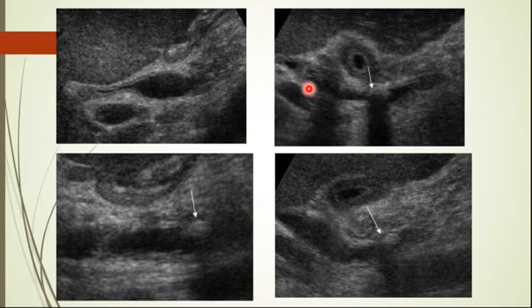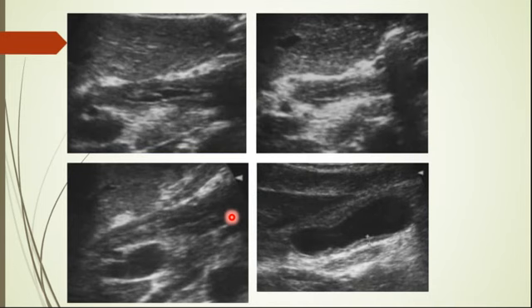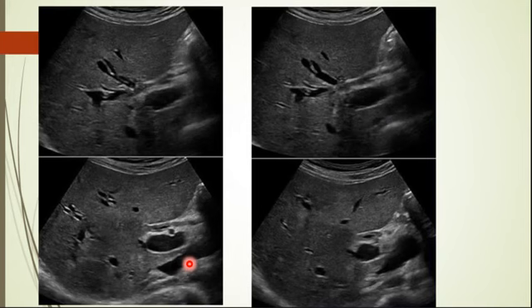You can see here, this is a common bile duct stone causing cholangitis. The caliber changes from normal distally to dilatation proximally. This is cholangitis due to stone. However, in this case, there were absolutely no stones. This was sclerosing cholangitis with thickening of the wall of the biliary ducts in patients with long-standing Crohn's disease.